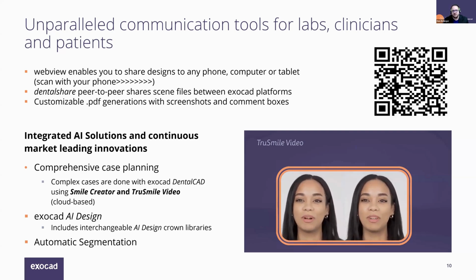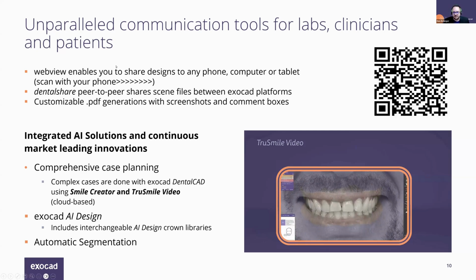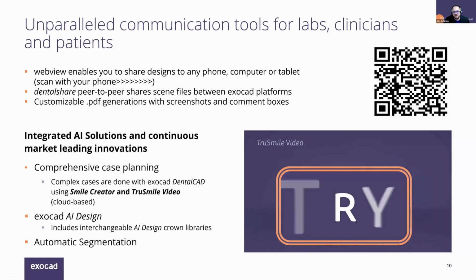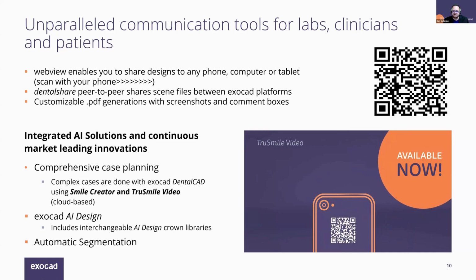And when it gets to the point where you want design approval, or to share that design with the customer, the dentist, the patient, you can turn all those objects on, generate a web view link, and the software is going to essentially create a URL, a website, for you to share with your customer. Then the doctor and patient can review that design, look at it on their phone, computer, tablet, and so forth, and really get an idea of what their new teeth are going to look like.